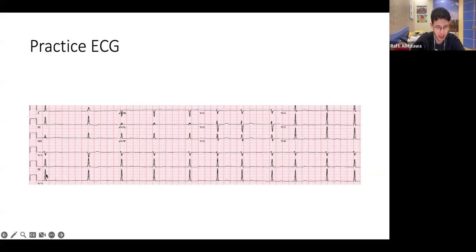You see that the QRSs are occurring at irregular intervals. They're still narrow. You may not see the fibrillation waves, but they kind of do exist. So by looking at this, you'll know that this is atrial fibrillation. This isn't flutter, you would see sawtooth waves. This isn't multifocal atrial tachycardia, you would see P waves. This isn't anything else that might be irregular. But this is AFib, and you can exclude the others. Compressed photo, clutch. Yeah, I think maybe if I expanded it, the fibrillation would show.